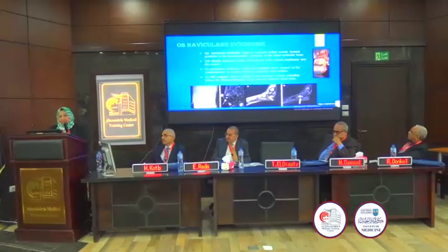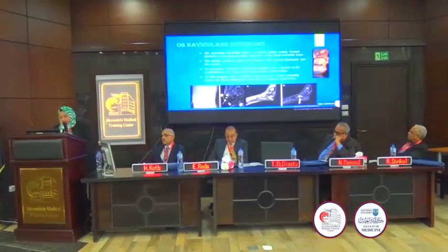Repeated stress from the continuous traction of the tendon at this accessory ossicle results in the syndrome, which is diagnosed on MRI by presence of edema either in the accessory ossicle alone, or it can cross to the adjacent parent navicular bone, with or without disruption of the synchondroses, as we saw in a lot of cases in the previous lecture, either with maintenance of the hypointense stripe of the synchondroses or presence of edema of the synchondroses, meaning that there is ongoing disruption of the intervening synchondroses.